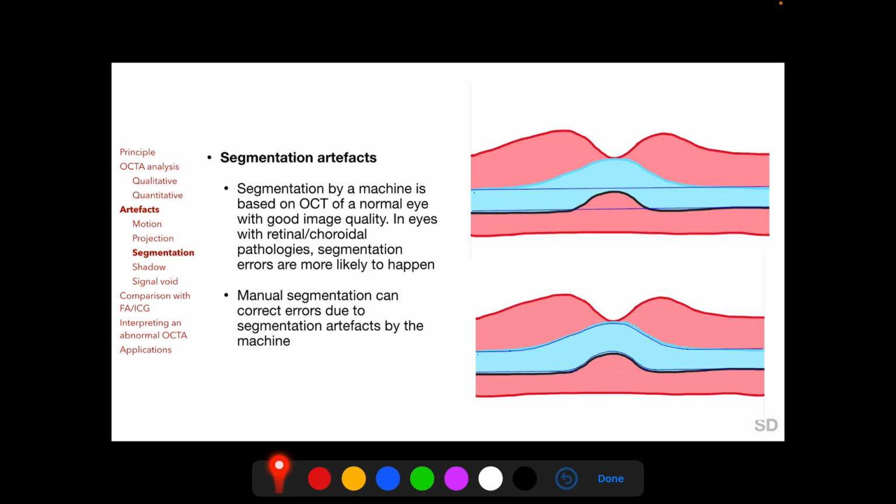So the en-face image of the outer retina generated from this failed attempt will display OCTA signals from this included area of choriocapillaris and will not appear completely dark as it should. So such an erroneous en-face image may generate the false impression of neovascularization in the outer retina, and manual segmentation can correct errors due to these kind of segmentation artifacts.